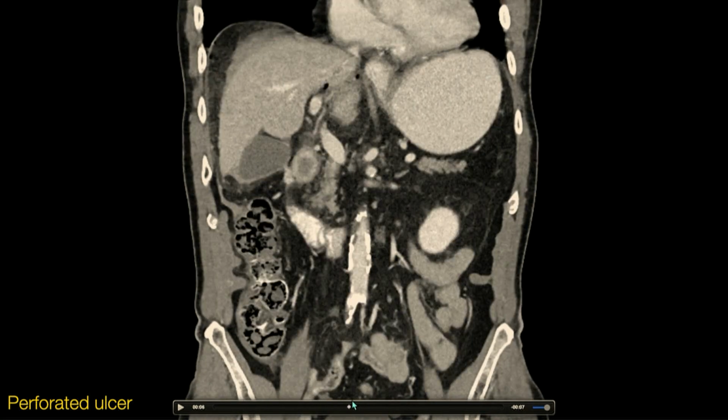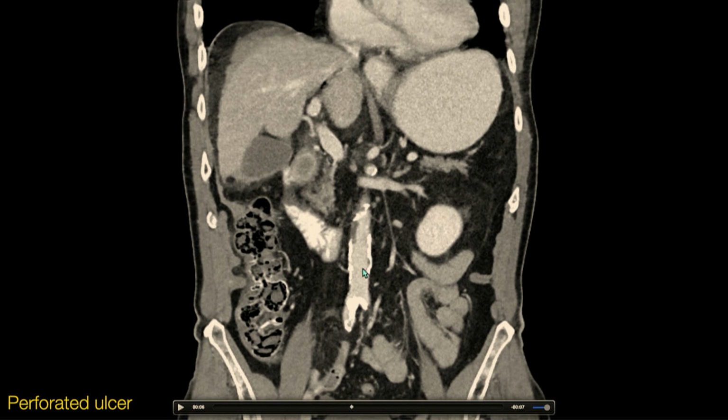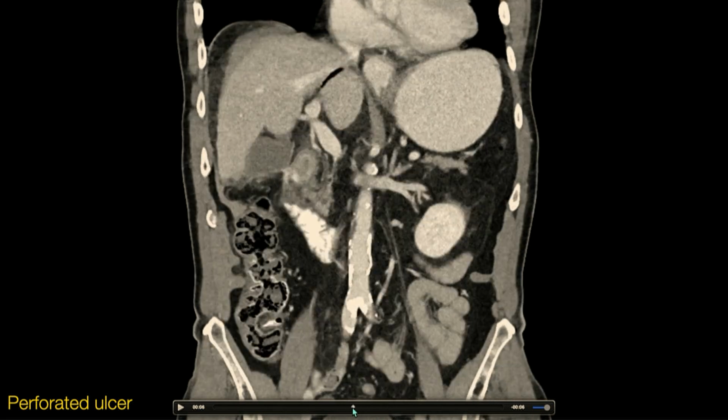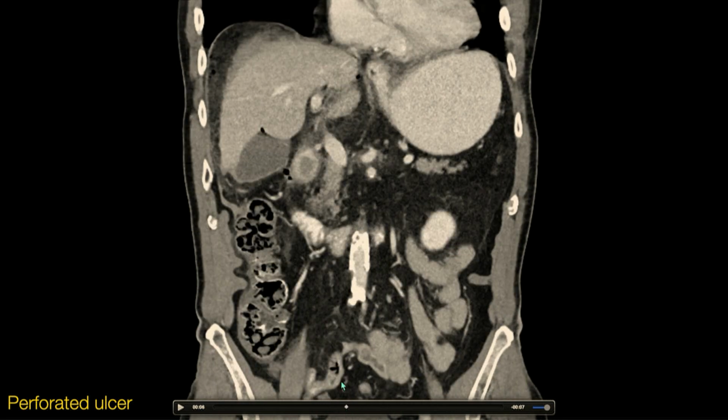there we go. And then you get a sense of that extraluminal contrast kind of leaking out. It's even kind of hard to see the hole, though. Like I mentioned, there's quite a bit of edema and coapting of those folds there, but that oral contrast leaking out along the lower margin of the gallbladder, and then that upper abdominal air and inflammation helps us to confidently make the diagnosis and guide surgical management and their incision appropriately.